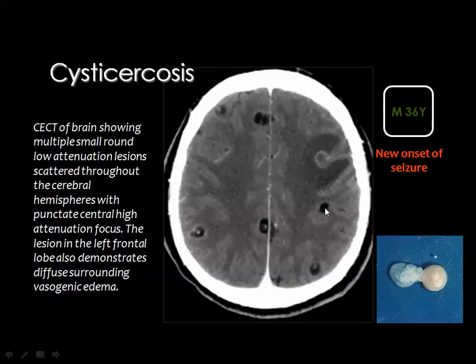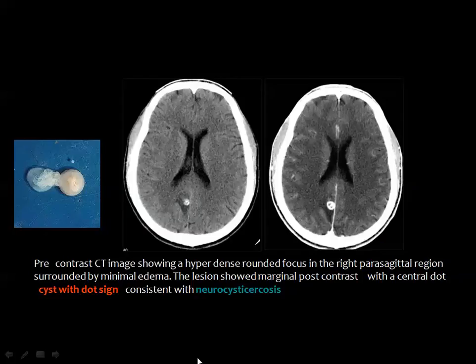And this is a CT image showing multiple cystic lesions with central dots. It is enough to see a dot within one of the lesions only. Then you consider all the lesions which do not contain dots as belonging to the same pathology.